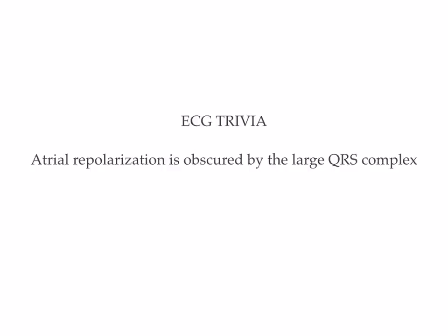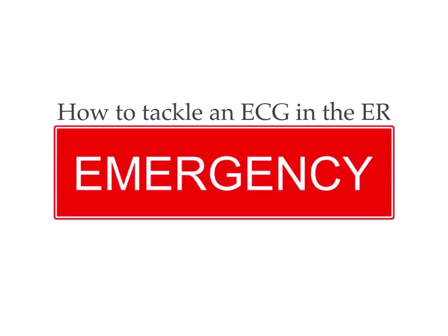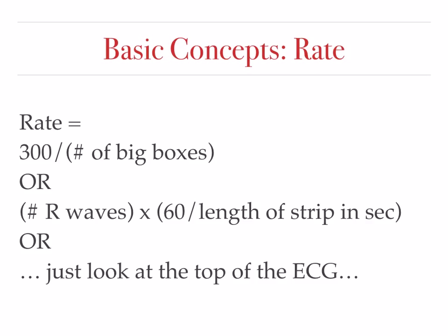So next we're going to tackle the most important part, and that's how to interpret the EKG in the emergency department. So let's start with some basic concepts first. The first concept being rate.